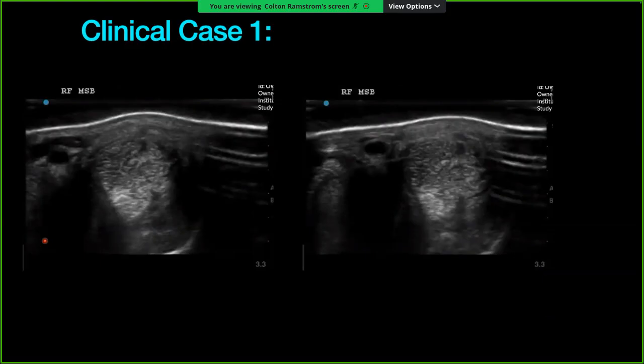Looking at the medial suspensory branch, we have some similar findings, a little bit less distinct tears, less distinct fissures, less distinct hypoechoic regions, but we certainly still have some hypoechoic regions here, maybe even a little bit more periligamentous fibrosis on the medial branch in this case. And then some pretty clear disruption of that, the dorsal border of the branch here.